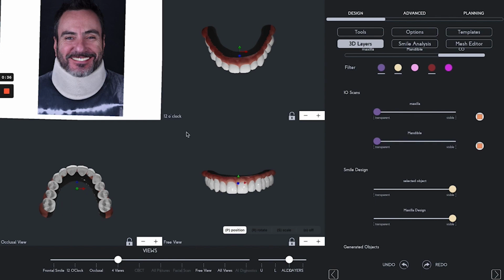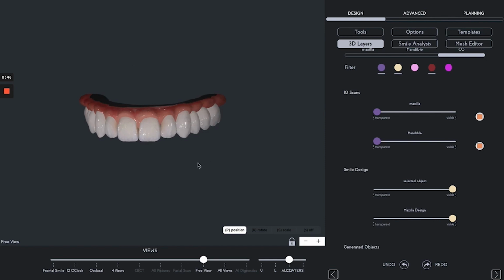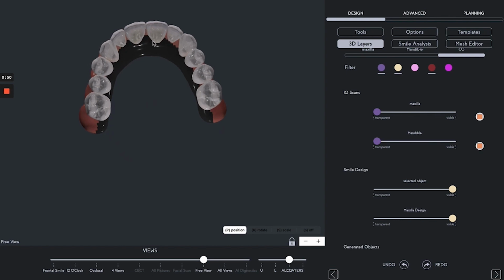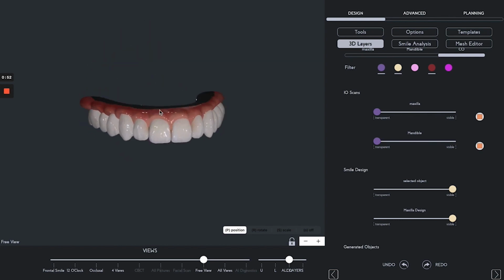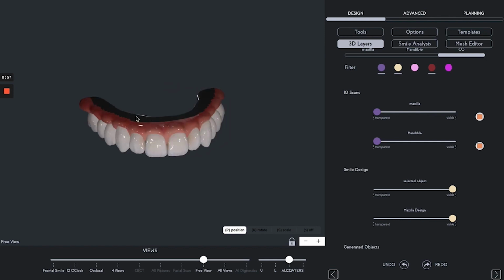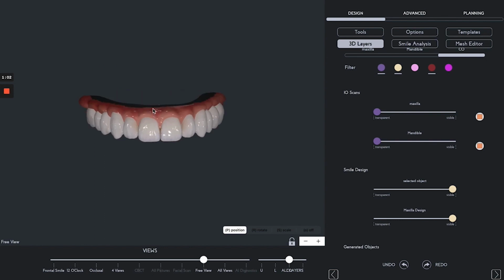So now that you have created the dental bridge, you can export the files. And when you export the files, you will be receiving a dental bridge just like the one that you are seeing here on the screen, which becomes crucial for your surgical implant planning, as well as for your dental technician to finalize the dental bridge according to your pre-surgical aesthetic planning.